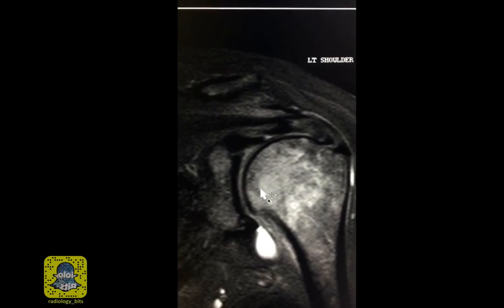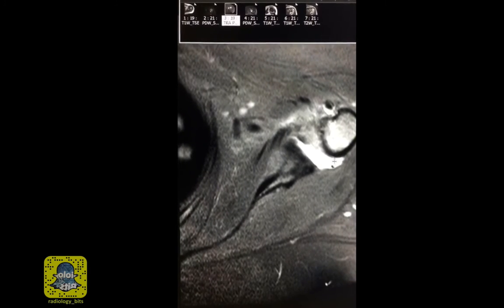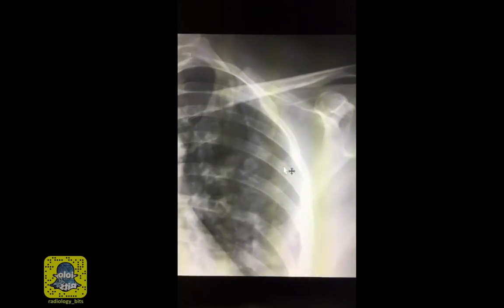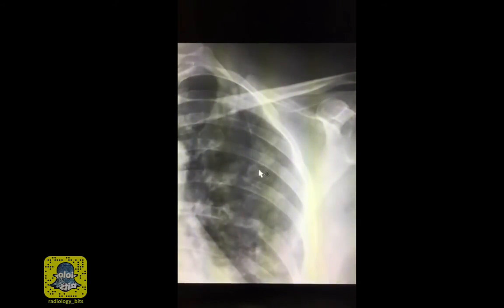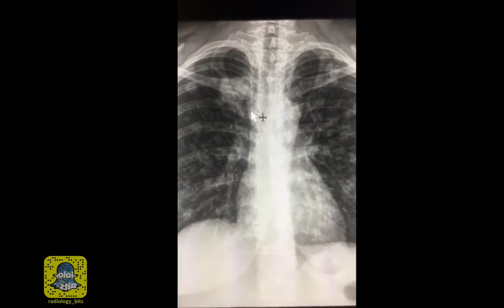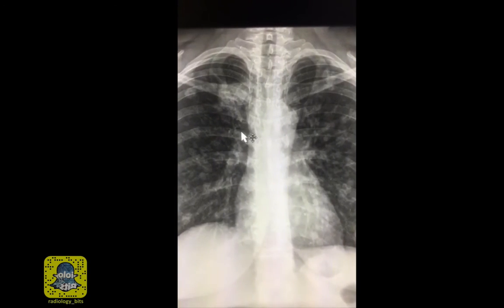One important point in approaching such abnormalities is to decide if the abnormality is involving one or both sides of the joint. What's even more important is not to fall into the satisfaction of search pitfall. You have a lesion here and you have lung nodules there, so don't miss that. The same concept was emphasized when we looked at the shoulder x-ray where there were nodules in the lung, so don't forget to look at everything you have. The concept was emphasized again when we looked at the chest x-ray. We saw the nodules, don't forget to go systematic and look at your hidden areas.